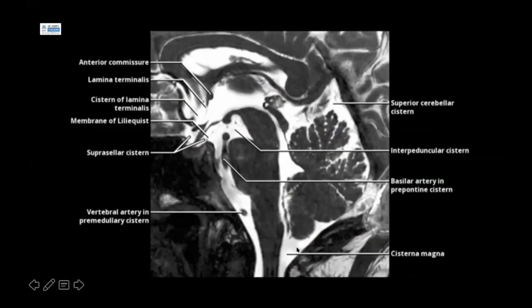And this is really the same anatomy on a sagittal MRI image. So again, pituitary region, suprasellar cistern in here, region of the 3rd ventricle, cerebral aqueduct into the 4th ventricle, foramen of Magendie, cisterna magna, pineal gland, tectal plate, corpus callosum, anterior and posterior pituitary, infundibulum up into the hypothalamus, and the optic chiasm.